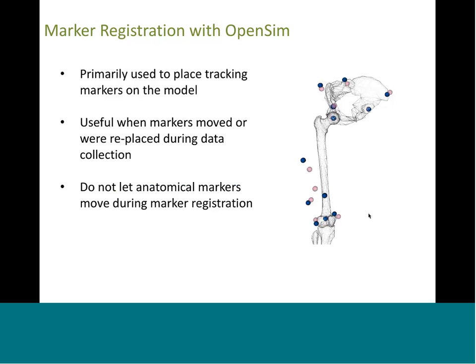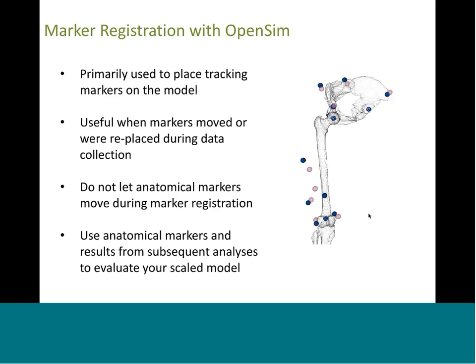We also learned not to let anatomical markers move during the marker registration process. These markers are important for evaluating your scaled model after the scale tool. However, the best way to evaluate your scaled model is to continue assessing your results as you complete subsequent analysis.